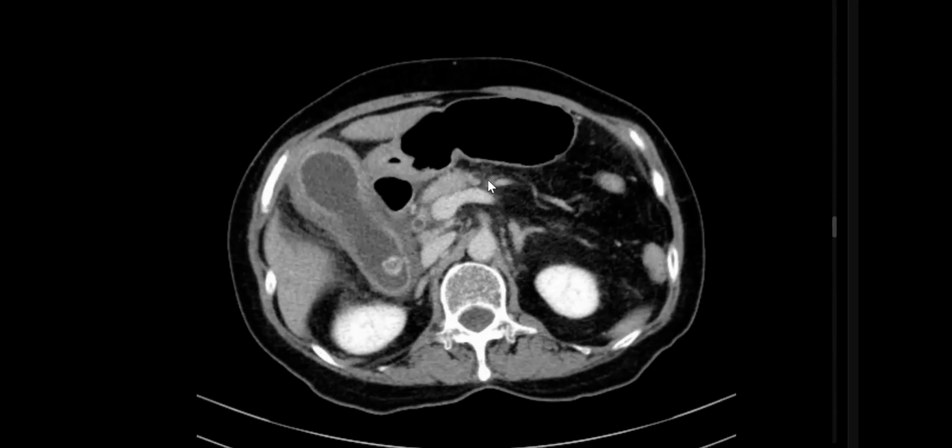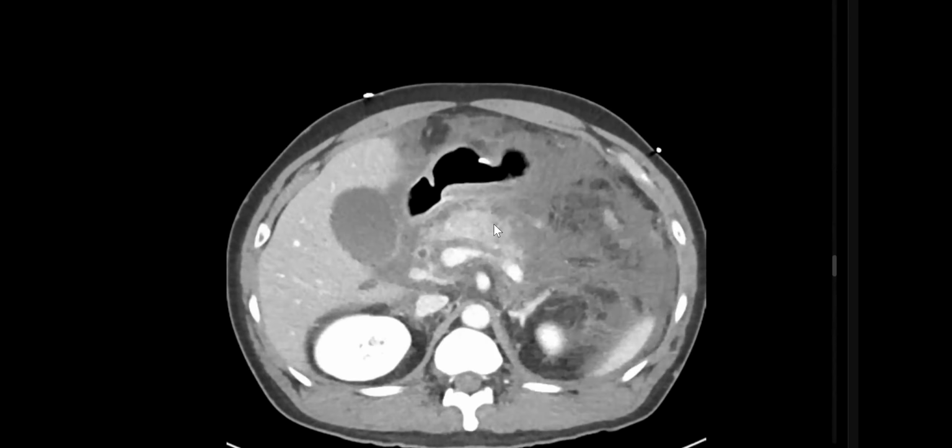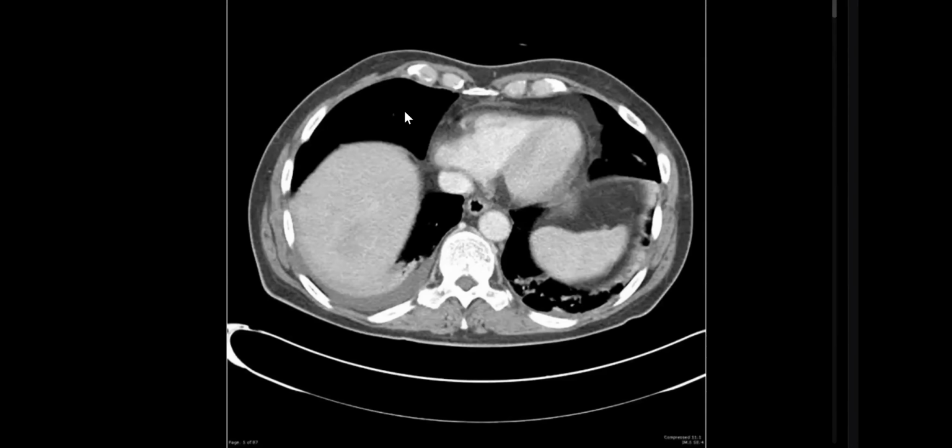By the way, in case of pancreatitis, reactive thickening and enhancement can be seen also. You remember this case of Dr. Amiga? It's reactive thickening and enhancement. Okay? The next case is the last one. I'll give you control again. Ask for control. So the previous case was classic acute calcular cholecystitis.